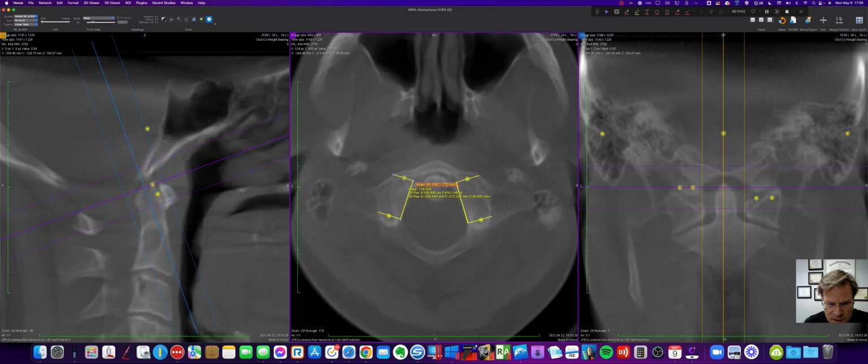Interesting. That's not what I wanted to grab. Okay, well, let's move that out of the way. Get that.